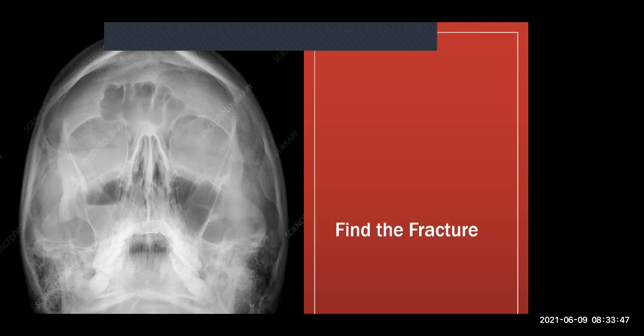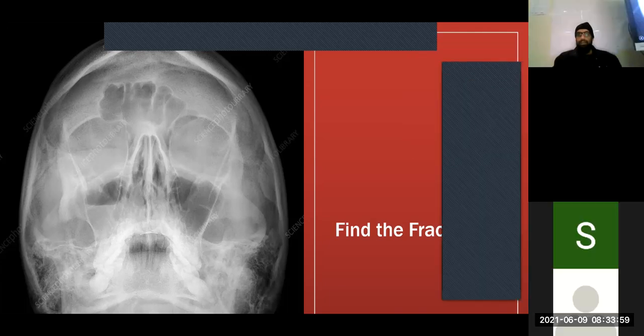Come sit. All right. So let's start with line number 1. Right. So this is an occipitomental X-ray, right? Which means that we're looking for injuries more in the mid-face. Okay, sorry, let me just put the video panel on so people can see what I'm talking about. So let's start here with line 1. So we're just going to follow the top of it. Do you notice anything? Or does anything look strange or out of place?